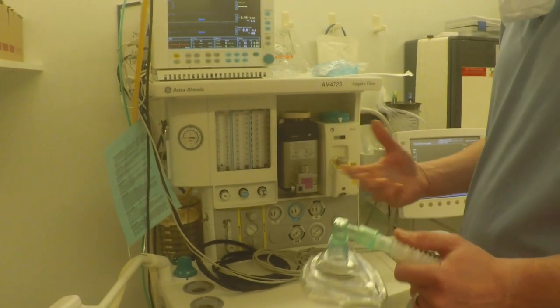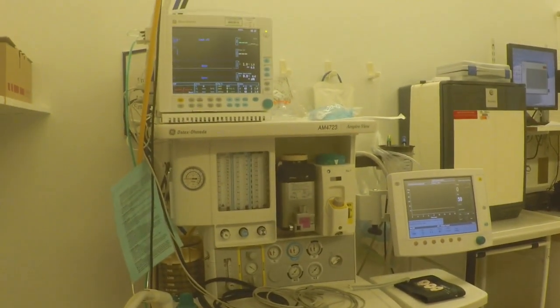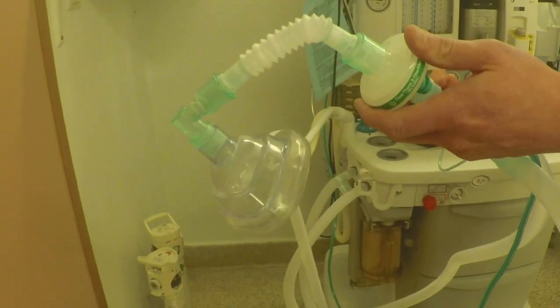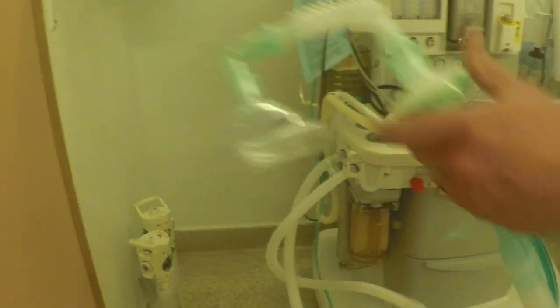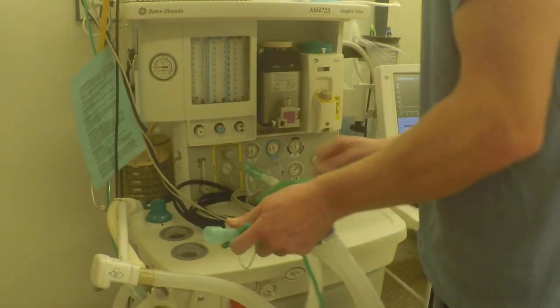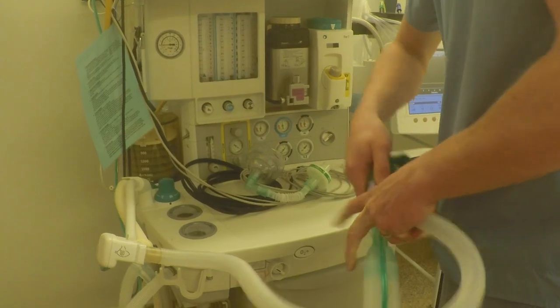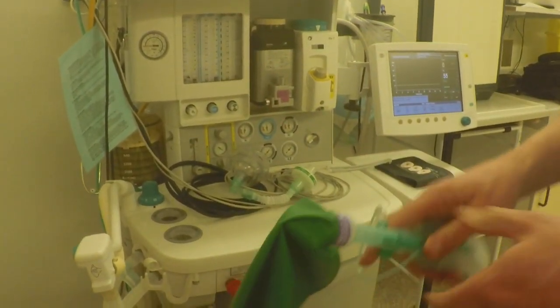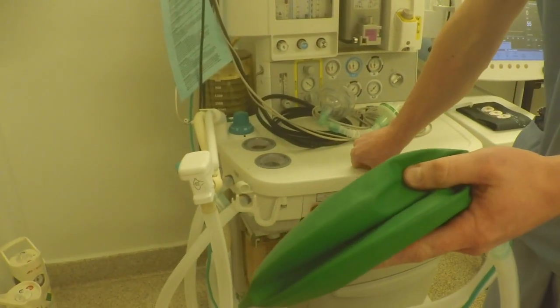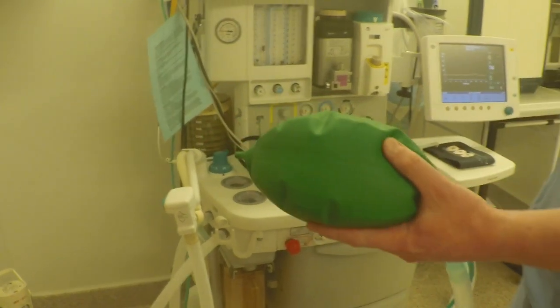After securing the airway and making the patient unconscious, they are then connected to the anaesthetics machine, which is also known as a life support machine. First, the mouth is covered with a mask that is connected via tubes to a bag and a ventilator. An example of this can be seen when we connect the ventilator to this bag, which simulates a lung. When we turn on the anaesthetics machine, the bellows start to move, creating pressure gradients and enabling the bag to inflate and deflate, which is exactly what is happening to the lungs.